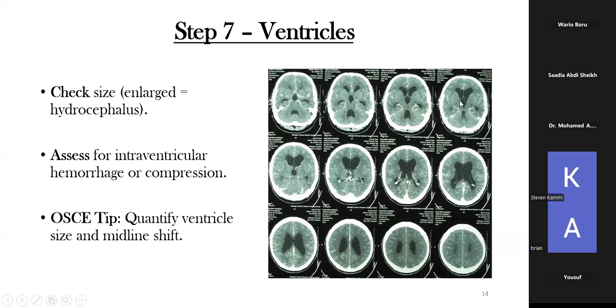So here you still have the cut that shows part of the body of the lateral ventricle, but it's narrowing. This actually is part of the body. This is not the third, sorry. The third is from here. This is the cut which shows, because it's continuous, the frontal horns. This probably should be part of the body. This is the occipital horns, frontal horns. And this is the body and atrium of the lateral ventricle, occipital horn, frontal horns, and then you're going all the way up to the lateral ventricle. So lateral, then you start seeing third, fourth, and then the horns of the lateral ventricle.